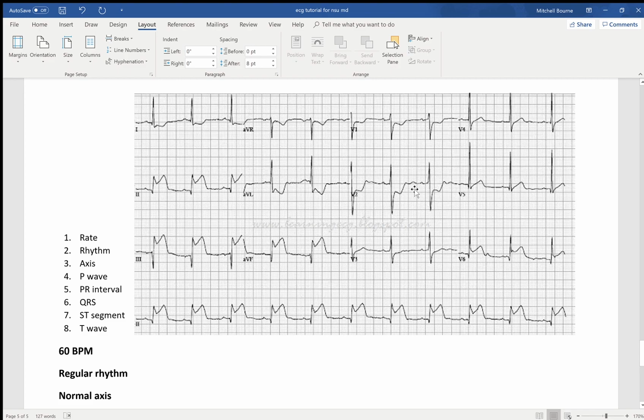So if the inferior portion of the heart is ischemic, and this is reciprocal to the posterior portion of the heart being ischemic, you have, it's right here, inferoposterior STEMI, which means that the right coronary artery has an occlusion in it because it's blocking the right coronary artery supplying the inferior portion of the heart, and it's also blocking downstream the posterior descending artery, I believe it's called, which supplies the backside of the heart.